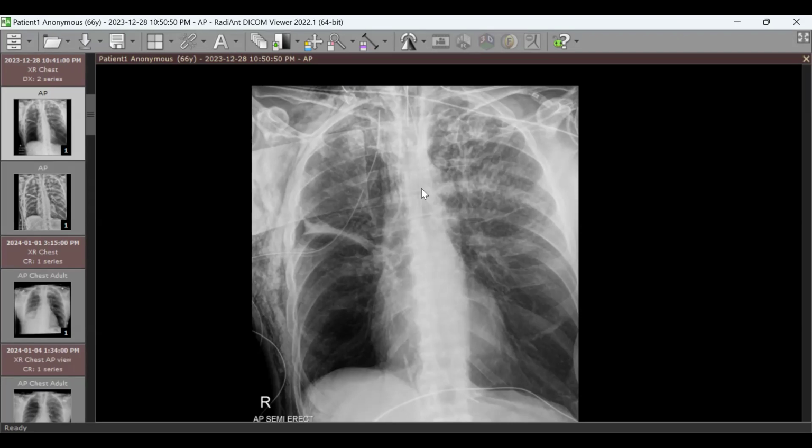In this superior vena cava, where do you want to see the tip of the catheter? Sir, the line enters through the SVC and reaches the right atrium. The cavo-atrial junction, right? Yes. The normal level is, this is the carina here, 1.5 centimeters above the carina, and from that point to 2 vertebral heights below the carina, that's an acceptable level. It would be acceptable if it is within this range for short-term use.